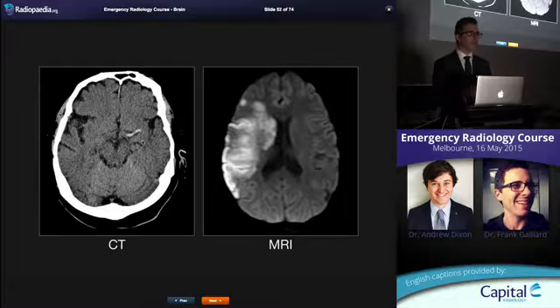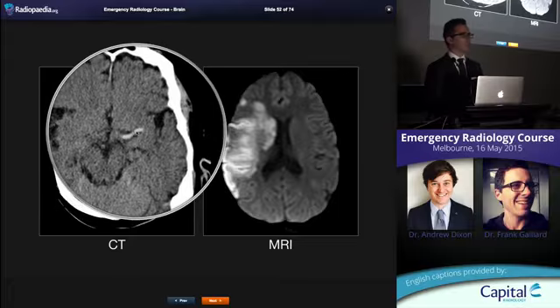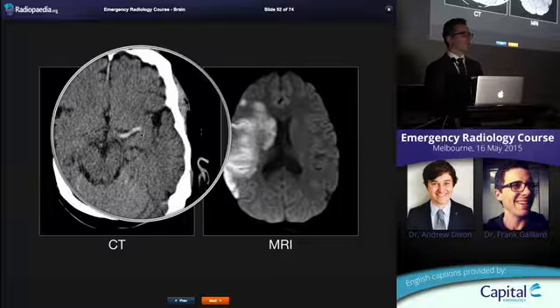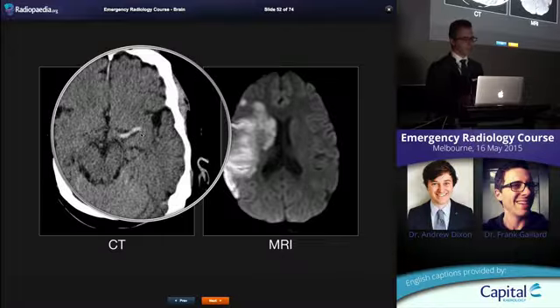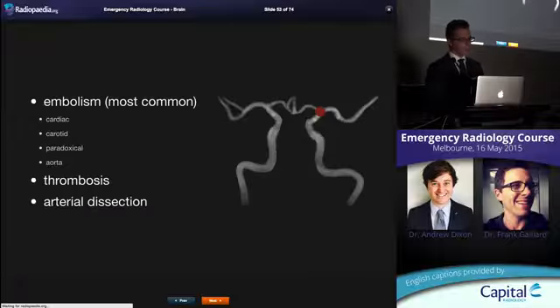And for years, all we had really was non-contrast CT. The first thing that we got taught is this hyperdense artery sign, usually the middle cerebral artery. This is direct visualization of the thromboembolism that's come from your carotid or your heart or wherever it's come from. It's gone up and impacted into that artery. And you would see that immediately because embolisms have formed somewhere else, they've had time to mature, they become hyperdense, then they dislodge, they flick up.